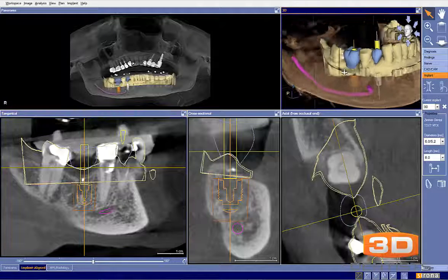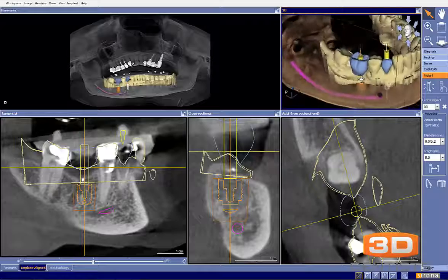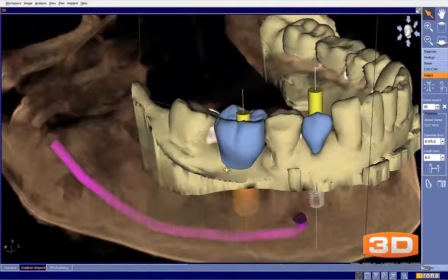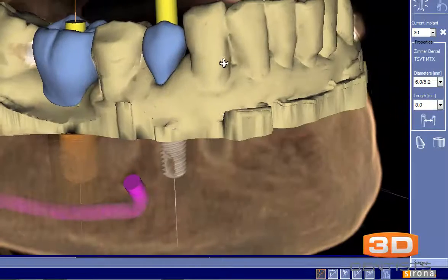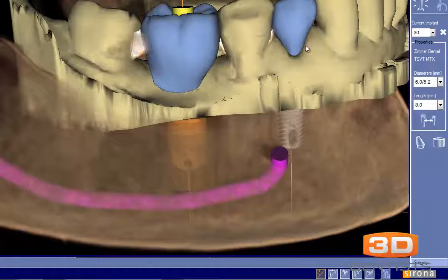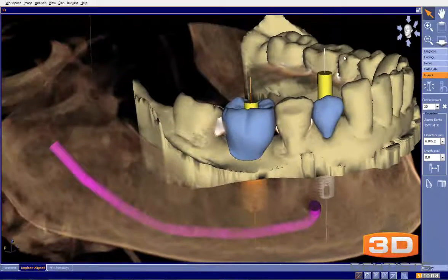Okay, we've been sent another plan today to evaluate a future implant bridge. This particular patient will be losing tooth number 29 according to the notes that were sent in. Tooth number 28 needs to be extracted, broken to the gum line, missing tooth number 30, and would like an implant bridge that extends from implant site 28 to implant site number 30 with a 3-unit bridge connected.